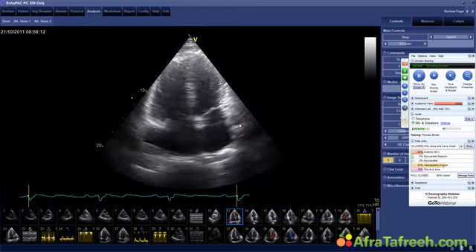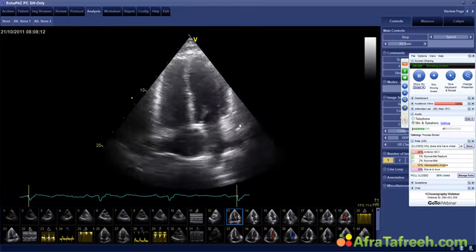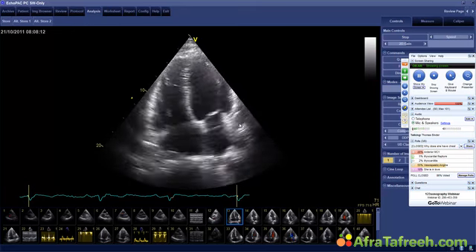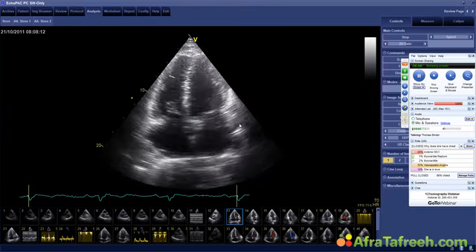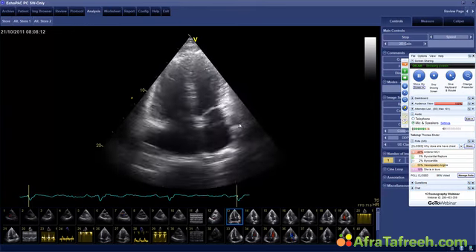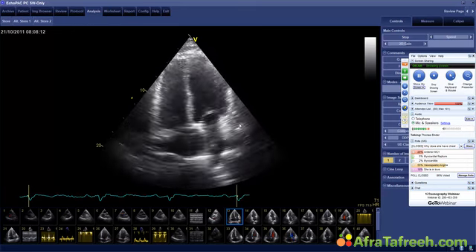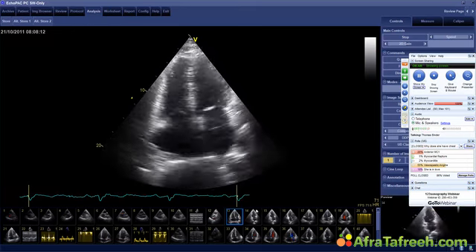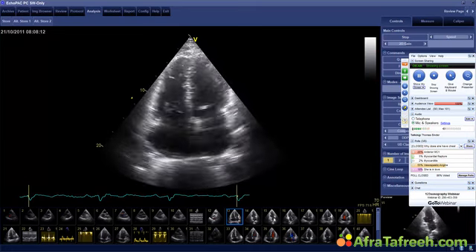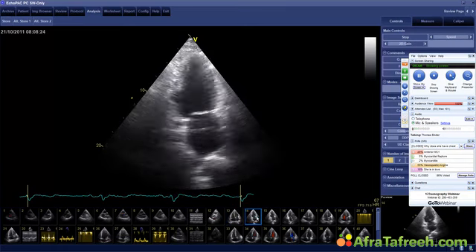especially left ventricular function, obviously, because left ventricular function would maybe explain his fatigue. When we explored him in more detail, he did say that he was not really doing so well with exercise, and he was always hypotensive, and he was trying to ride his bike, and he just couldn't exercise at the capacity that he could before.